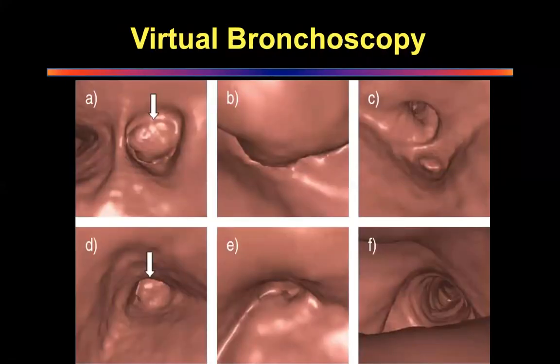Virtual bronchoscopy is an excellent tool, really gives you a good idea of endobronchial lesions even before you put in a bronchoscope. So just on a CT scan, you have the option of recreating it. It is a very good tool we use in EMN quite a lot, electromagnetic navigational bronchoscopy, where we recreate the airway and recreate the pathway to the tool.